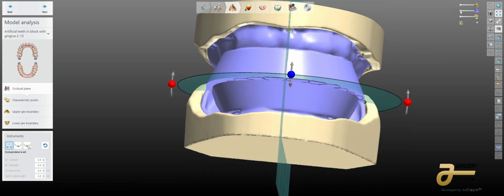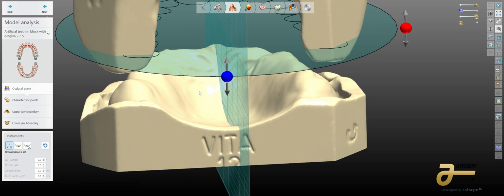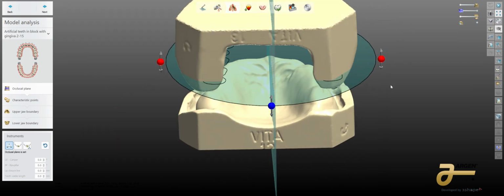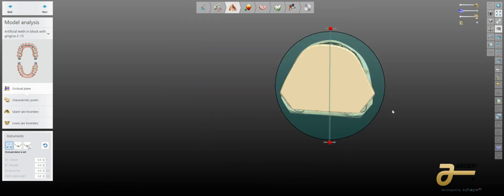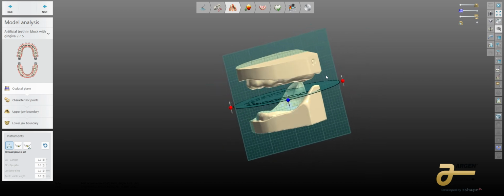And if I shine this out and take it down and I look from the lingual aspect, thank you, my friends at Vita, for providing these wonderful study models for us to be able to practice our craft on. Let's go ahead and just set this up. And I do this very specifically, guys.